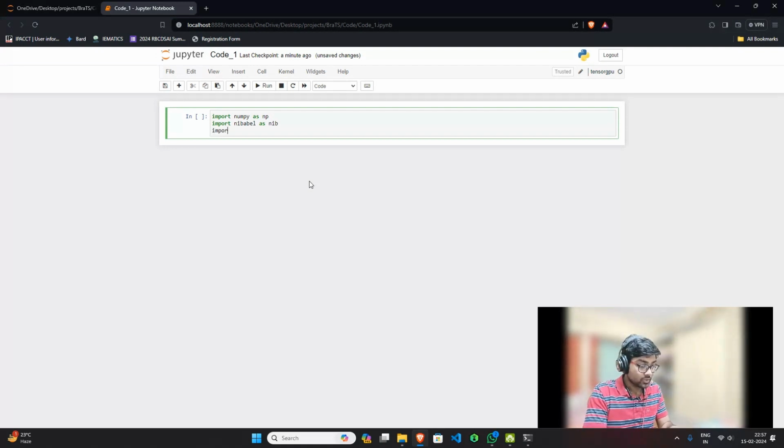We can import this later on, but just because we know we need these things, we are importing this right now. That's not something that will stop the coding at first, because matplotlib will not be needed right now. It will be needed when we extract all the images. So we are doing that in the later part. Yeah, so I think we have to run all these things.